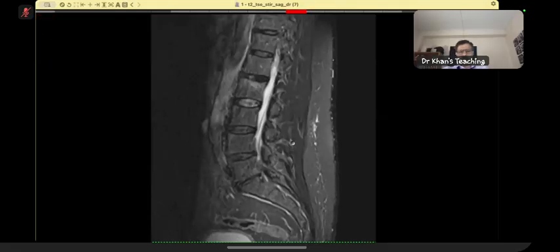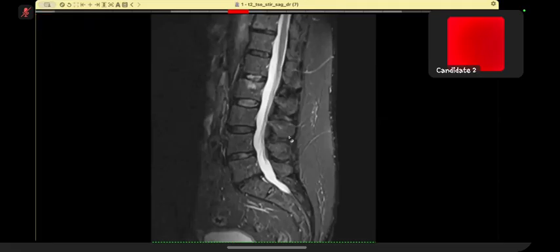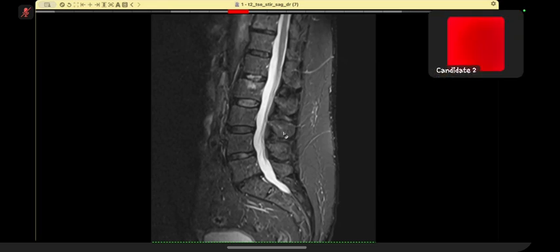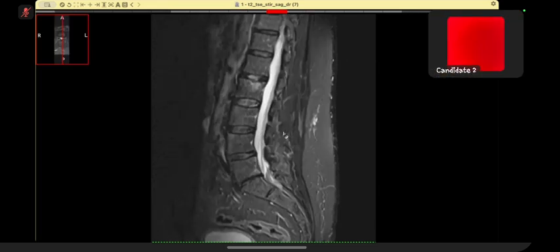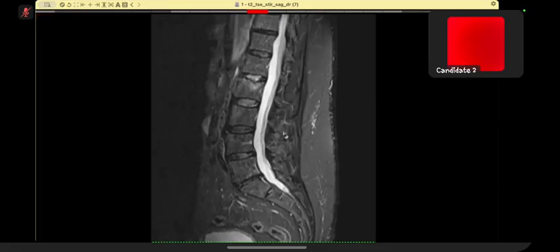No, I'm not interested in the aorta. Look at the vertebral bodies. In the vertebral bodies, in the lower corner of the upper lumbar vertebra, I can see that there is, at L2. Is there any finding in L2? There is a high signal intensity within the disc space with some underlying bony irregularity of the superior end plate.